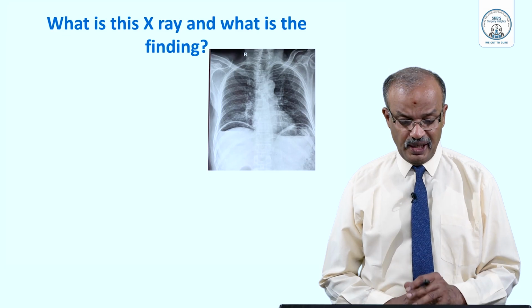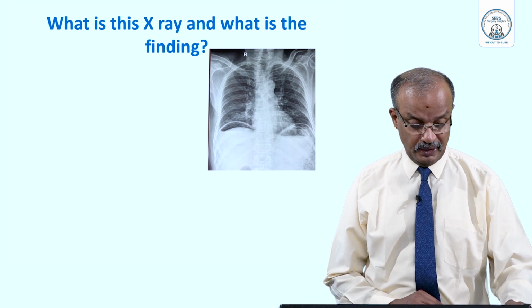Hello students, today we will discuss a very important X-ray in your exam, especially it will be kept in OSCE, in your final year surgery exam, and instrument in X-ray discussion also it will be shown as such. What is this X-ray and what is the finding? Just to go through that.